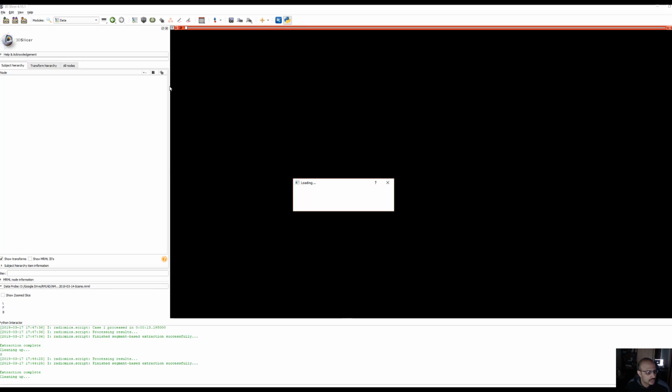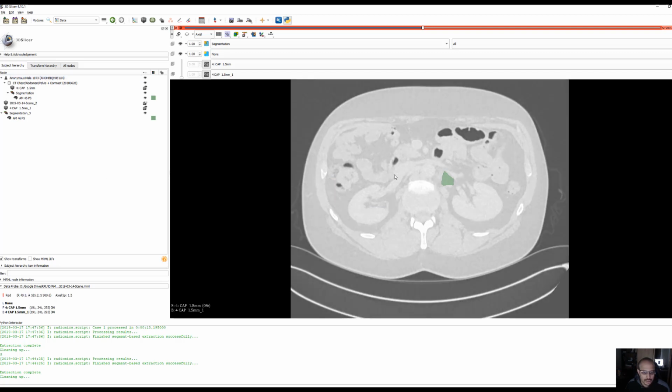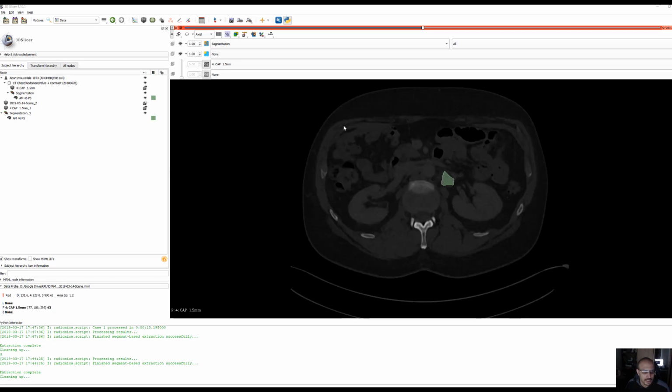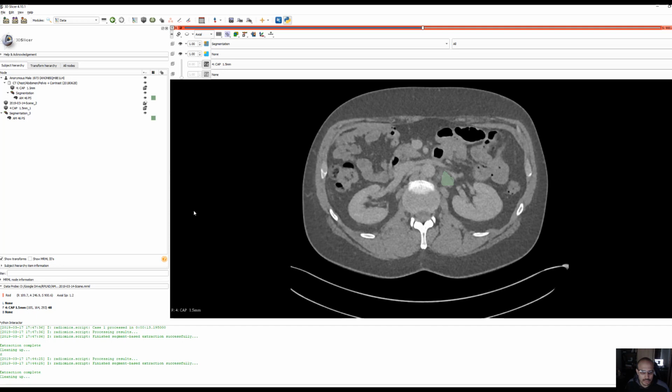Okay, so remember we're in this data view. Now that looks clean. Right, so I'm just going to window it a bit. I want to see inside the segmentation. Once again, for some reason you've got two volumes loaded and I think they're identical, so I'm going to deselect that. Yep, they were both superimposed on each other, so I'm just windowing it to look at it.